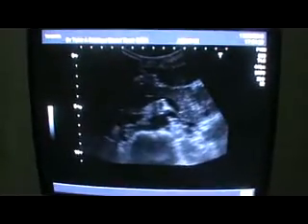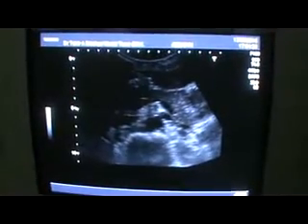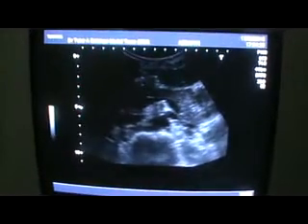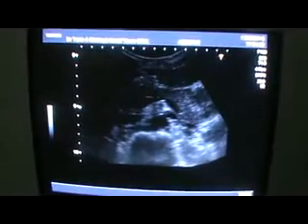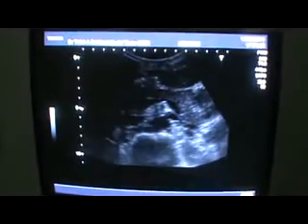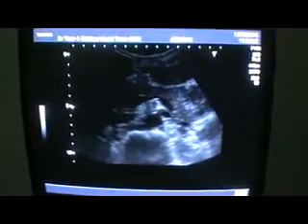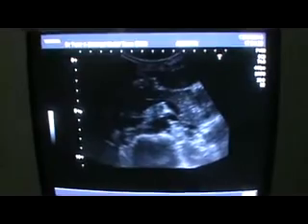So this is the case of the day, relating to the pelvic region: a complex vascular mass having cystic and solid components of aggressive nature with fluid in the right paracolic gutter, which requires further interventional procedures and biopsy, etc. Thank you very much.